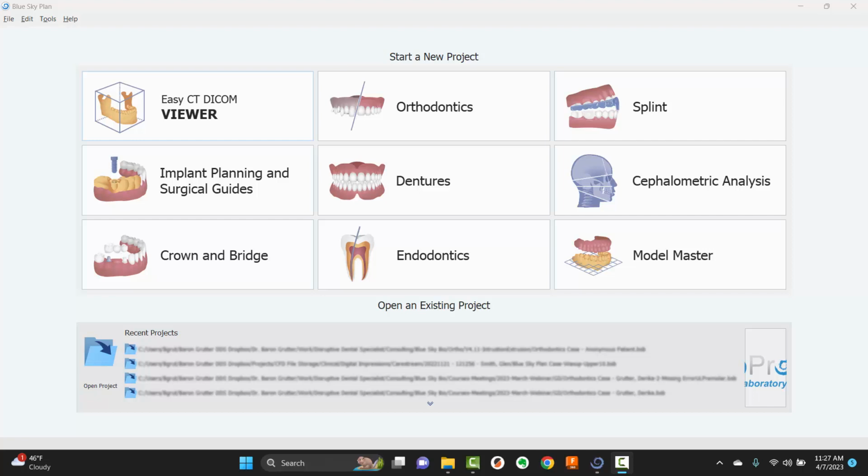So I'm gonna do my best in this video to stick to the facts, the normal workflows, and just to show how to use the software. This is not about, wow, here's a great case, let's talk about it specifically as it relates to this. I just want to show you the workflow. I'm going to try to cruise through here.